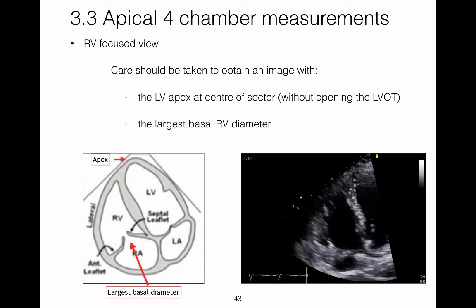When acquiring an RV-focused view, care should be taken to ensure that the LV apex remains at the center of the sector. The LVOT should not be open, and the largest basal RV diameter should be displayed.